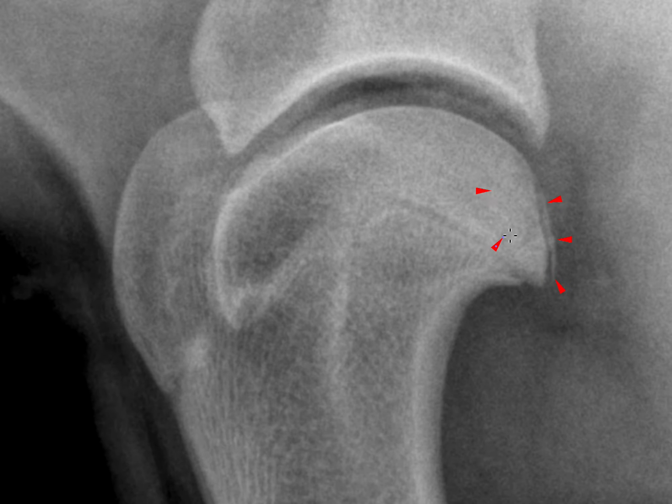As for this area here, probably we have a combination of factors, which is sclerosis adjacent to the defect, but also the defect itself and that partially mineralized flap. They slightly surround the humeral head and they are therefore superimposed on it.